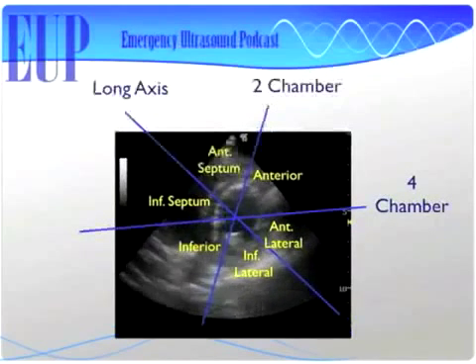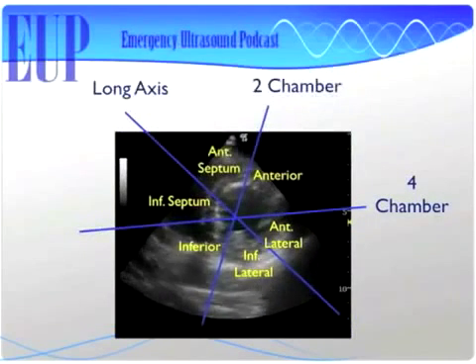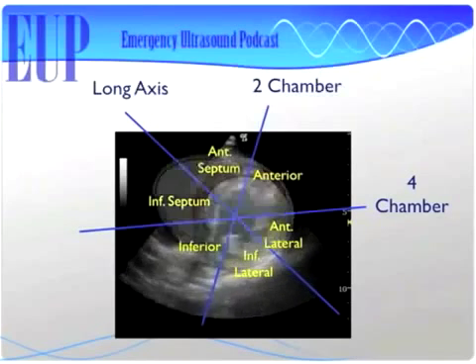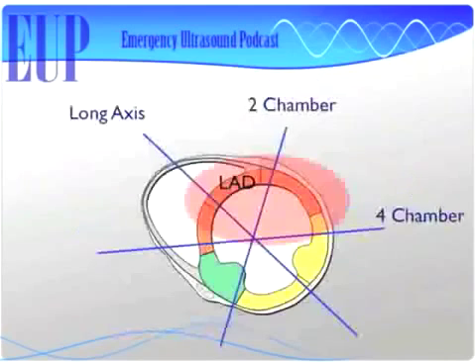Now, there's a lot of noise going on there. What does all that mean? Well, so here's an example of it going through the actual image of the heart and then the heart overlaid on top of it. The important thing is here. This is the important thing.